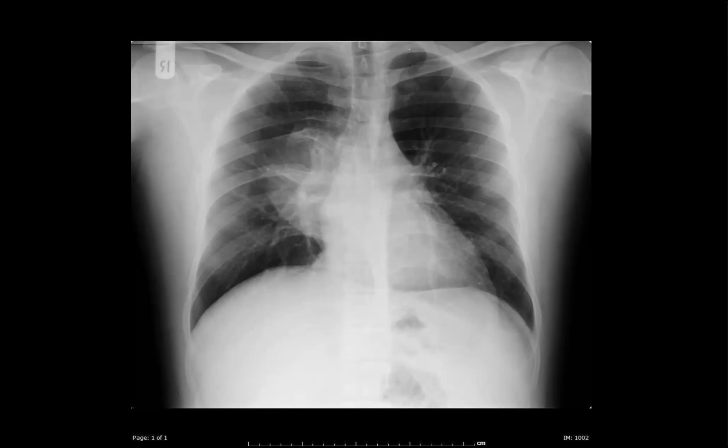You mentioned it's a posterior mediastinal mass because, first, the right cardiac border can be seen through this lesion, so it is not anterior. And it is not middle mediastinum since I can see the hilar vessels, the hilum overlay sign. Any definitive sign? It's posterior.